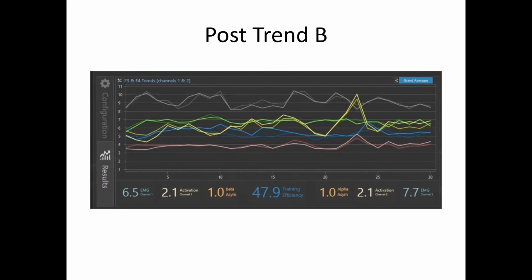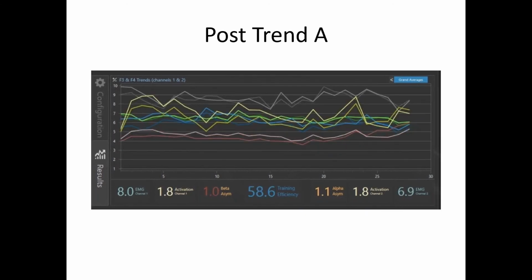Now, it may be that you just only get this far and you keep going. You're up at session 12, 13. We're still here and we keep backsliding. Well, the brain's accepting the invitation, but it's getting tripped up either by poor physical health or poor social health environment.